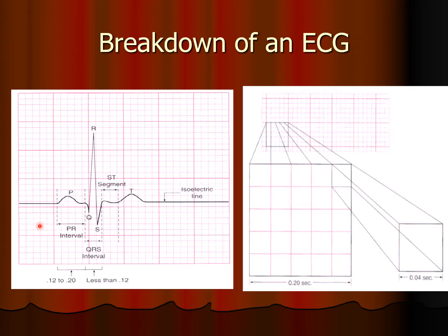When we're learning to do ECG interpretation, all of you little duckies out there that are going to be going in and maybe working on a telefloor, when you're interpreting whether or not something's in sinus rhythm, you look at a lead 2, okay? And in a lead 2, there should be a P wave before every QRS, and it's upright, perky, not to sound crass, but it should be like a nice, young woman's bosom there. It should be upright and perky and round. It shouldn't be puckered. There shouldn't be any weird notches in it.